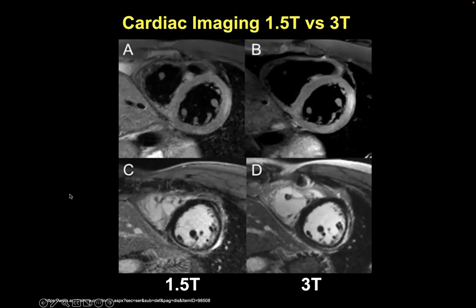I should have put up 0.5. I'm not sure if a slide exists like that. I've actually seen a system like that. And they're becoming pretty popular, actually. It was first started, I think, at the NIH. They started doing lots of studies comparing them.